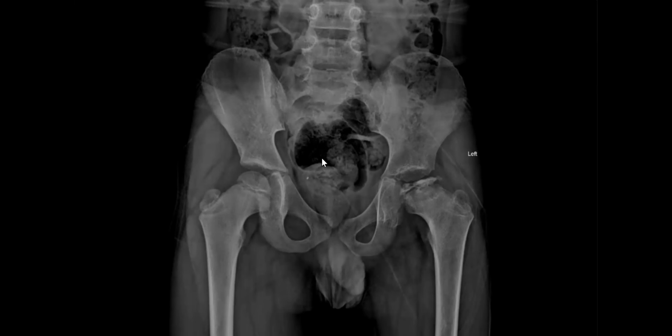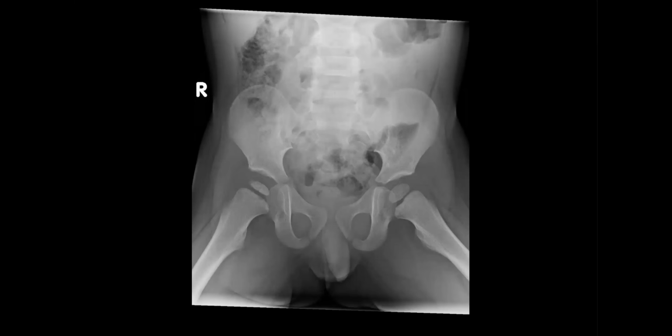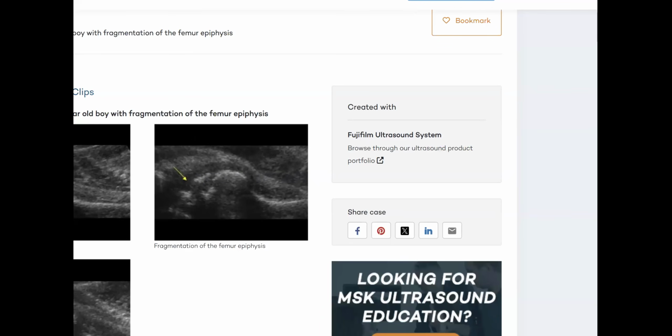Sometimes the urinary bladder or rectum is displaced to the left side, so it will be a renal transplant. Or surgical clips, it will be a renal transplant. Or sometimes you will see a convoluted tube like this one, a peritoneal dialysis catheter. Or a lead pipe, featureless colon like in ulcerative colitis. See the associations. Alcohol use, of course, but in adults.